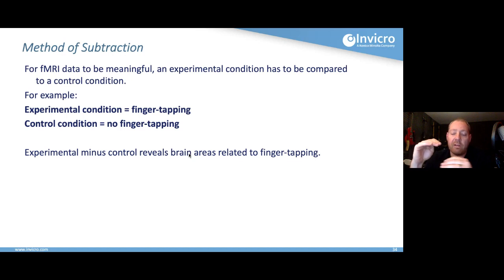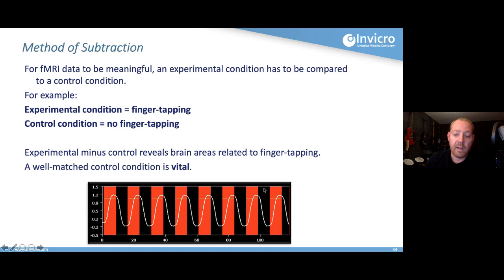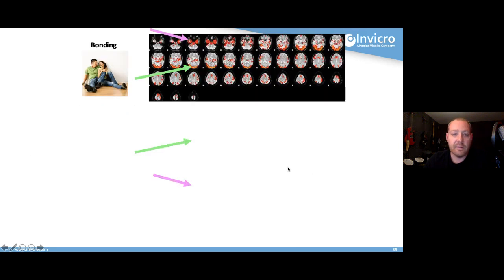And you have a very high baseline level of activity throughout the brain, and then your task related activity sits on top of that high baseline. So you usually want to subtract that baseline using your control condition. And if you do it well, oh dear, these arrows are all wrong. So you end up with something like this.